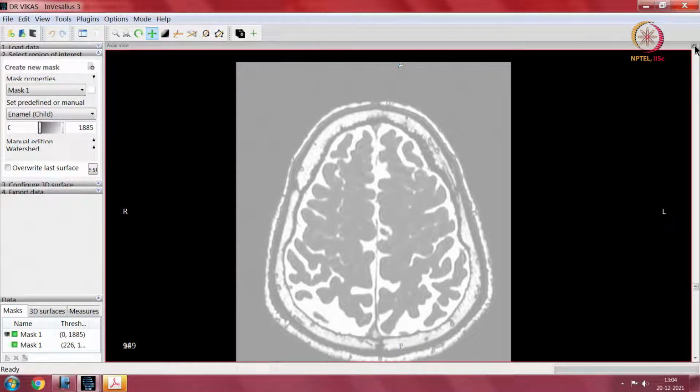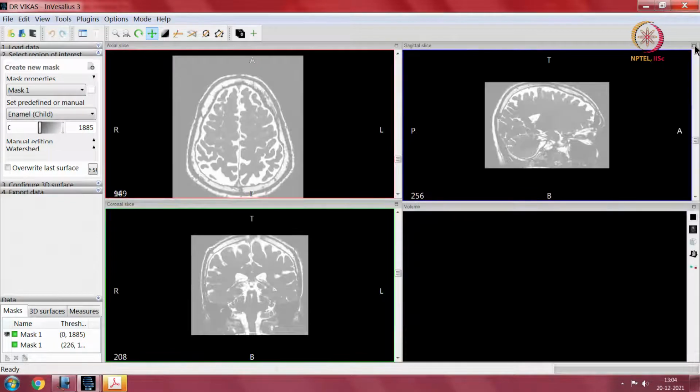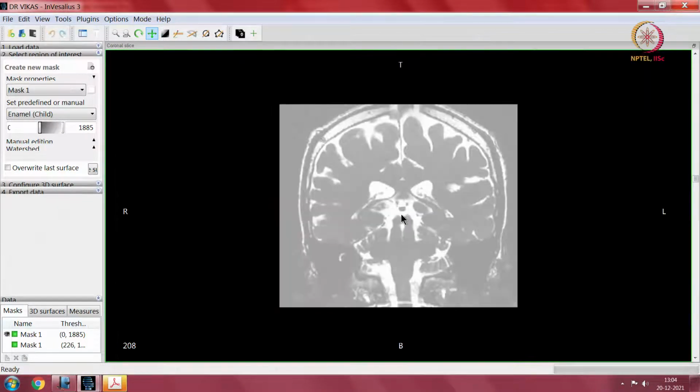As clinicians and surgeons, we are told that we should not interpret from a single imaging sequence. That refers to sectional sequencing, that is axial, coronal and sagittal, but it also refers to various MR sequences, that is T1, T2, FLAIR, contrast, etc.